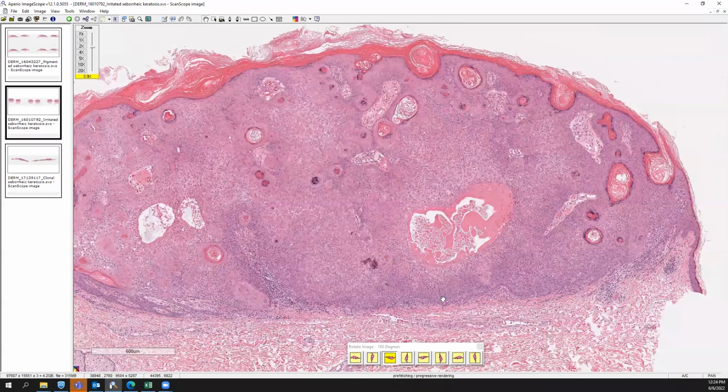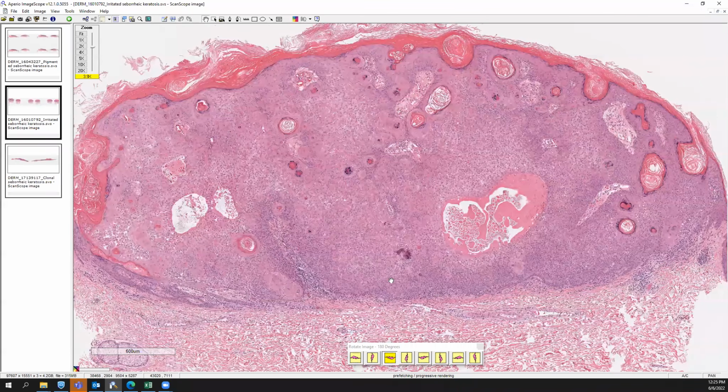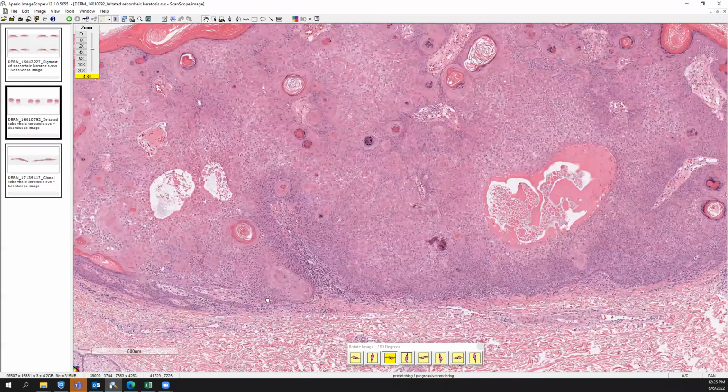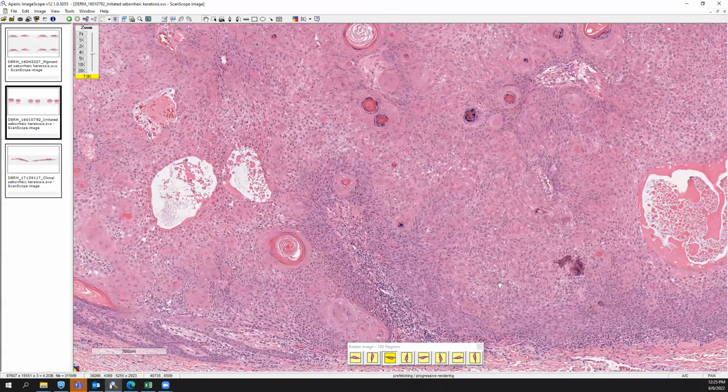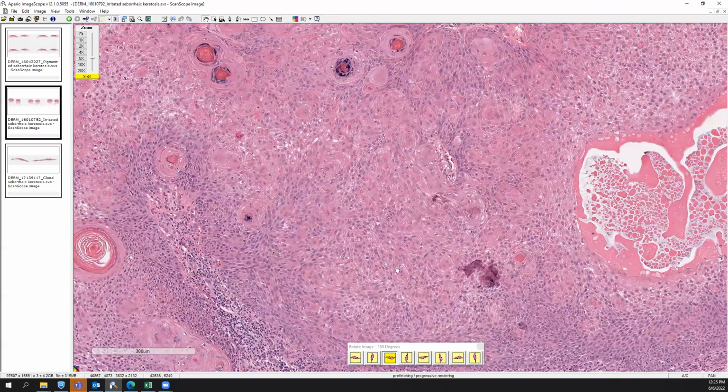Moving on to another example of a seborrheic keratosis, this could be a little bit more tricky. You can see that it's a well-circumscribed, pretty symmetric lesion. You see, again, those milia-like cysts spread throughout. So architecturally, it's enough for a seborrheic keratosis, but there's some differences with this one. This one's a lot more inflamed. So you see lymphocytes at the bottom of the lesion and percolating up into the body of the lesion. You can also see these whorls, these squamous eddies of glassy keratinocyte change spread homogeneously throughout the lesion.